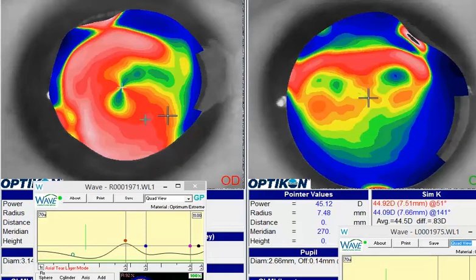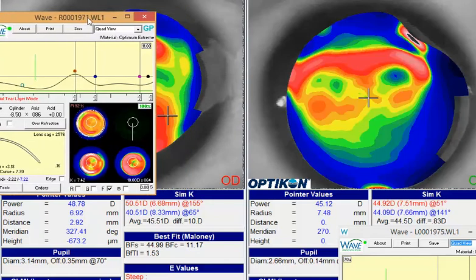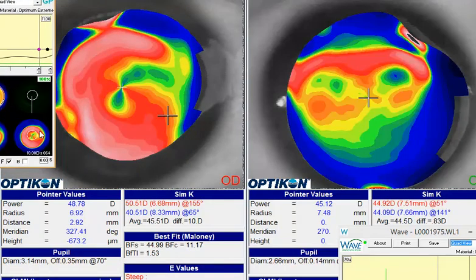One of the things that you can do, I find it helpful, when you have such an irregular cornea, when you're designing these lenses, you want Wave to pick up as much of the contour as you can to help that lens center and fit as well as you can. Quite often I avoid averaging the corneal astigmatism, because you'll see in your design it looks like you did choose averaging. And if we look down in that lower right hand corner at the Wave interpreted topography, all of a sudden you have a lens that looks almost symmetrically red in that lower right hand corner, as opposed to the C-shape area of redness that you have in the true topography.